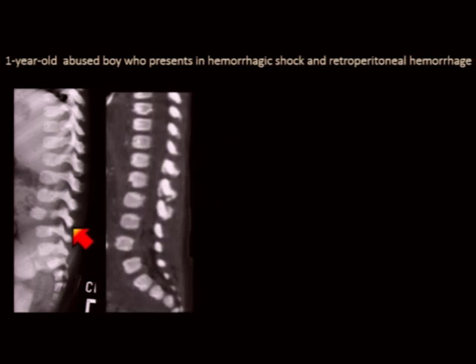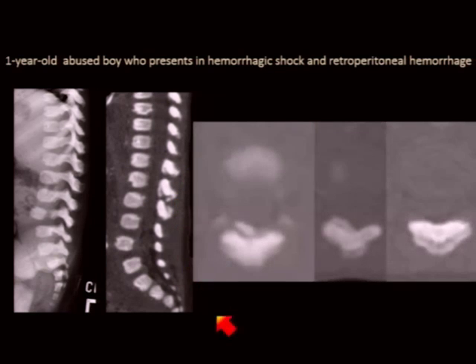Now, once you've established that there is trauma and that this is likely child abuse, the clinicians will want to know, can you date this injury? With careful scrutiny of that lateral plane film, I think you can make out the irregularity along the posterior aspects of the spinous processes. This is what it looked like on the sagittal reformatted image, and you can see, again, the irregularity of the posterior elements. On the axial images, you can see that that represents mineralization or ossification within the paraspinal soft tissues. So this is a nice example of myositis ossificans.